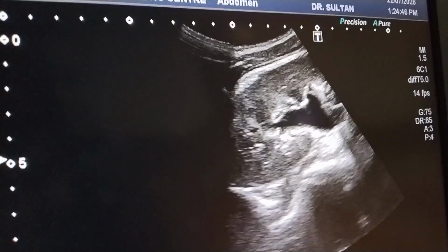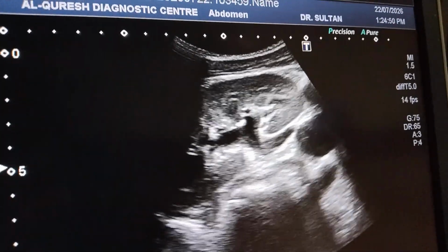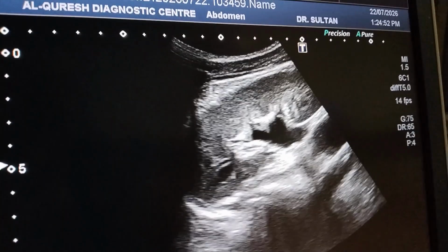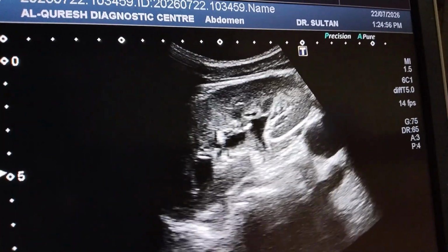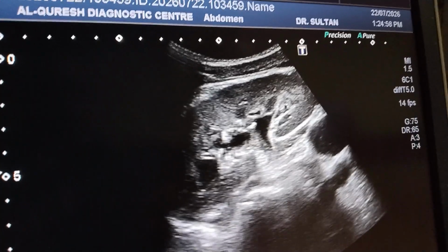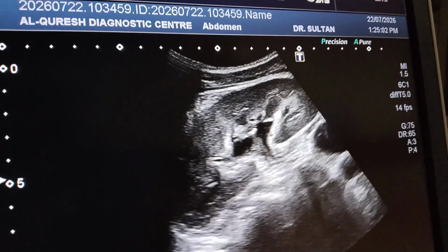This was all about the echogenic focus, whether it is a stone, sinus fat, or whether we can use the term concretion or we cannot use it. In my opinion, try to avoid this term as a substitute.